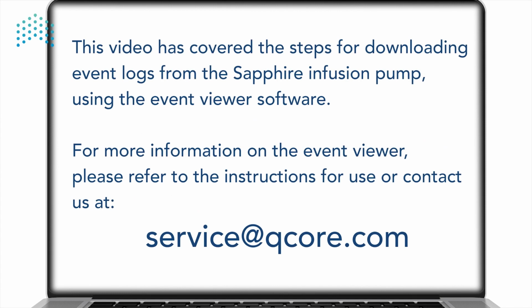This video has covered the steps for downloading event logs from the Sapphire infusion pump using the Event Viewer software. For more information on the Event Viewer, please refer to the instructions for use or contact us at service@qcore.com.